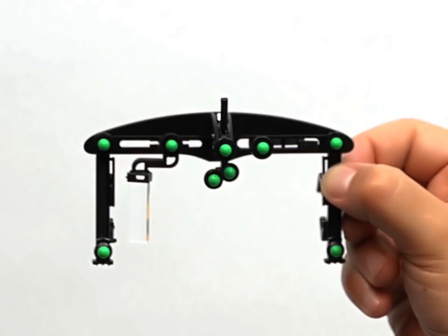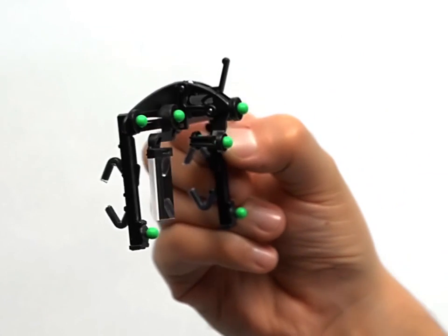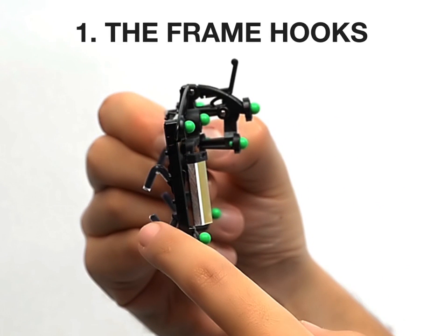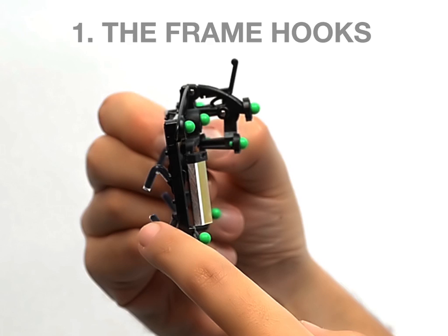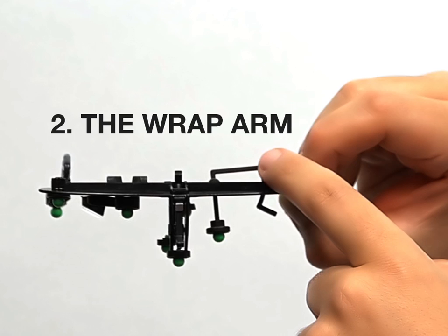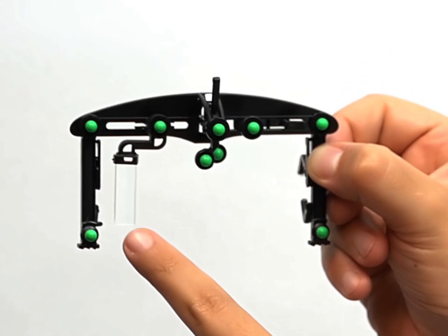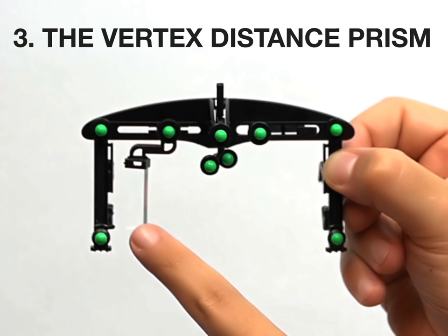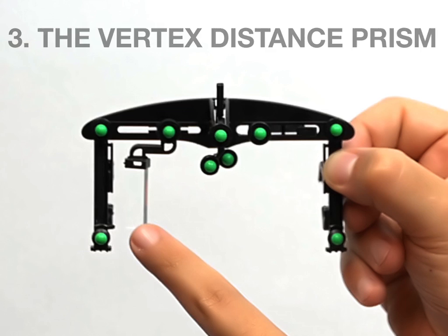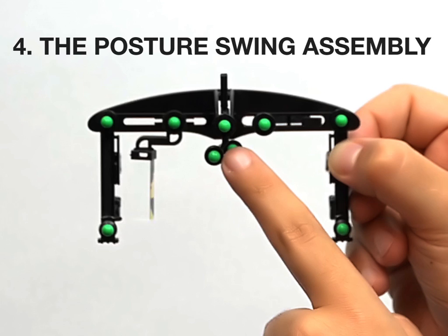The EY stick consists of 4 main elements: the frame hooks, the wrap arm, the vertex distance prism, and the posture swing assembly.